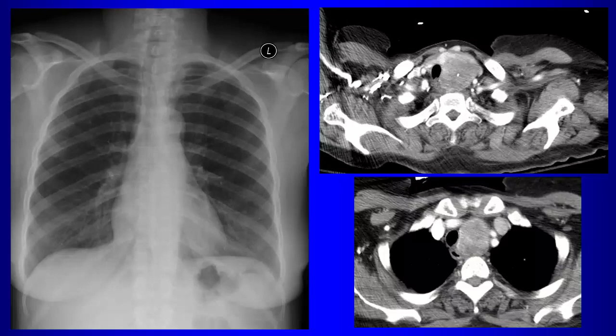Because it is kind of embarrassing. I mean, there are cases that are even worse than this. It gets kind of embarrassing if you read a chest radiograph as normal and the clinician calls, you know, this guy's got an 8-centimeter left thyroid mass, and the trachea's deviated all the way over here because you didn't really pay attention to it. Okay?